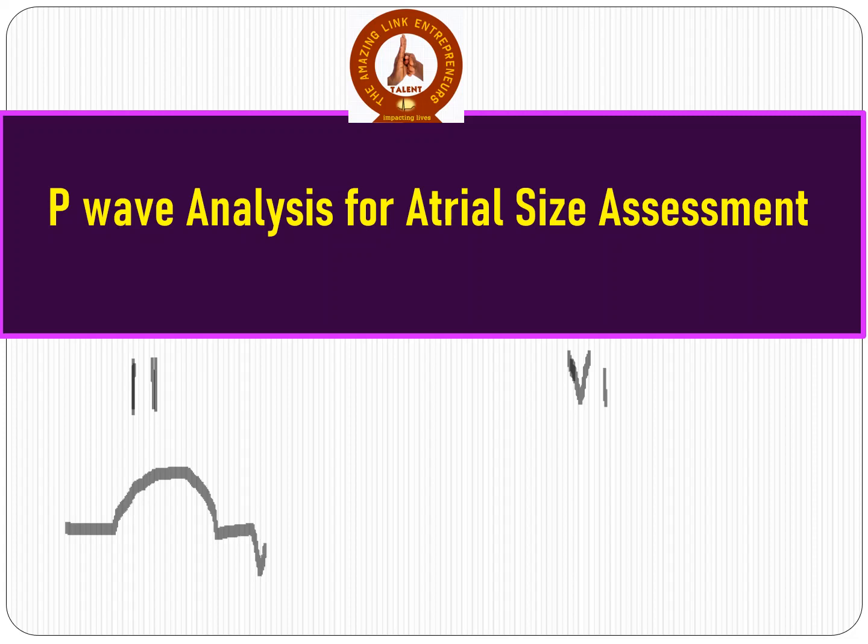We put it in the context of the QRS complex. In analyzing the P wave, we consider 3 important components.